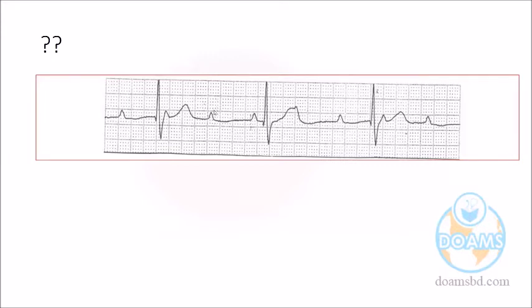So, doctor, this is the P, right? Yes, this is the P. The next P, where? Can I give you the annotation? Can you show here if I give annotation to you? Sir, I don't know how to use it. Sorry. Who can take annotation? Another P is there. Just to know, how many participants are here today? Would anyone be interested to get the pen here to mark where the P is? Then I can give the chance to annotate.